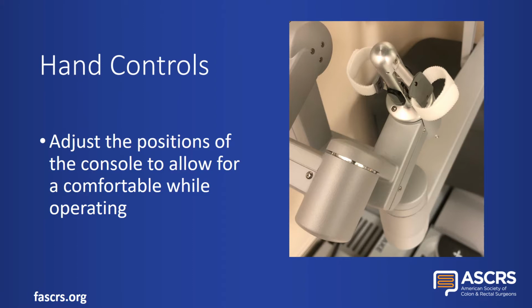There are 2 hand controls which control the robotic instruments and camera. The surgeon places a thumb and a finger within the grips, similar to gripping a surgical instrument during an open procedure. Movement of the instruments inside the patient mirrors the movement of these grips. For example, opening and closing your fingertips opens or closes the instrument jaws, and rotating or articulating the finger grips will rotate or articulate the instrument head.